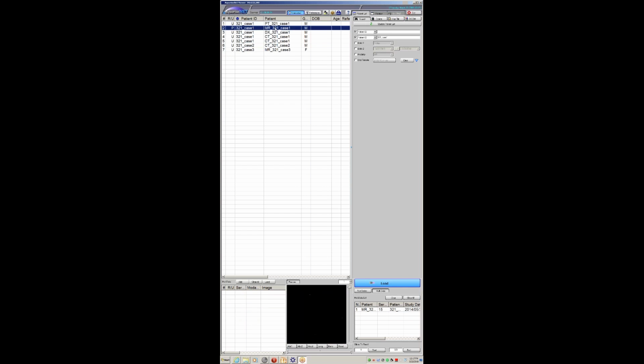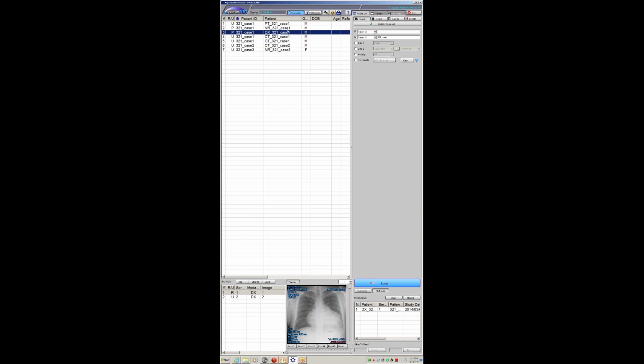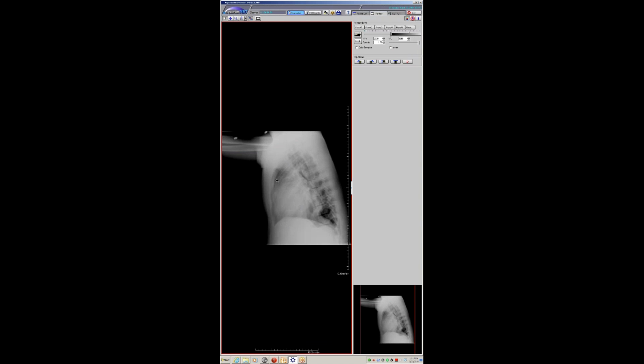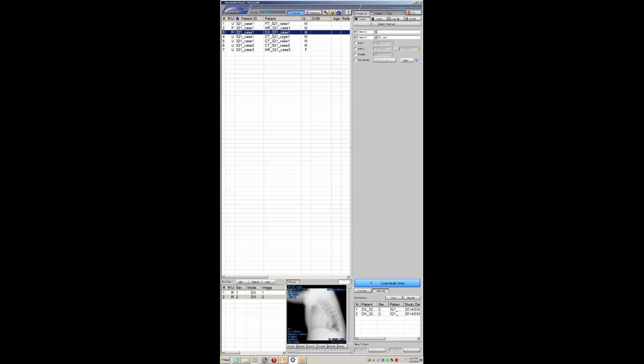Okay. So this is a case, a little bit of an older case, but I found it, of a young kid presented with severe shortness of breath and chest pain. I think most of us can see that the heart has cardiac contours, very globular appearance. Pedicle appears normal, but the cardiac silhouette's quite dramatically enlarged on the lateral. Can't really see the quote unquote Oreo cookie sign, but nonetheless suggestive of a large pericardial effusion.